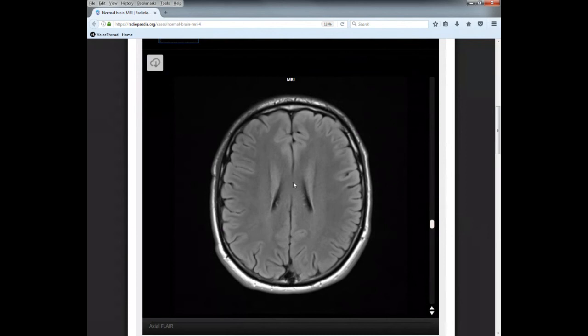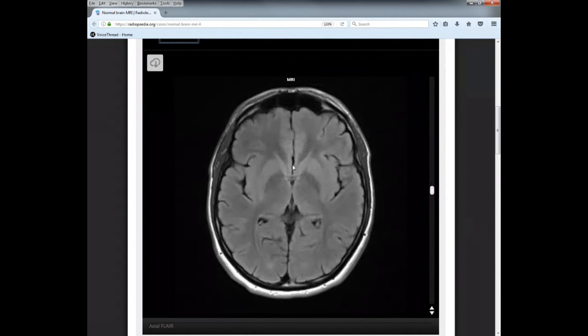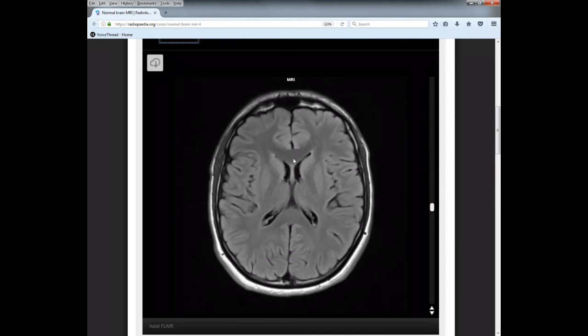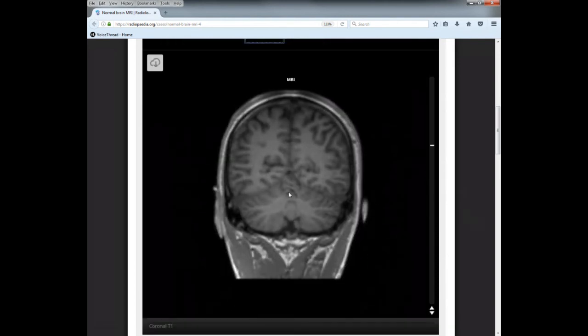When I'm looking at it down from the top or up from the bottom, I'm seeing the body first as a slice, and then I'm seeing the genu and the splenium, and then one little section that moves a little posterior and inferior to the genu is the rostrum. Okay, so that's your corpus callosum in the axial view. We can also see it in a coronal view.